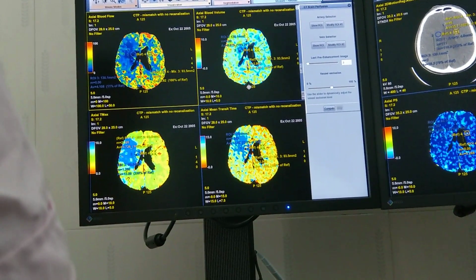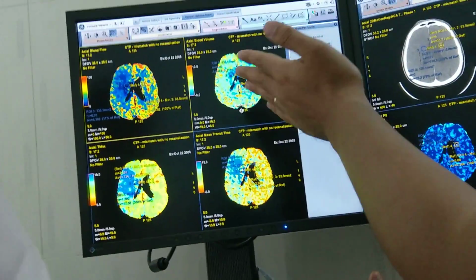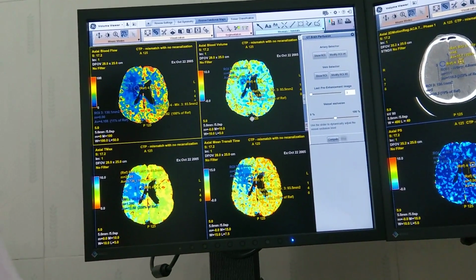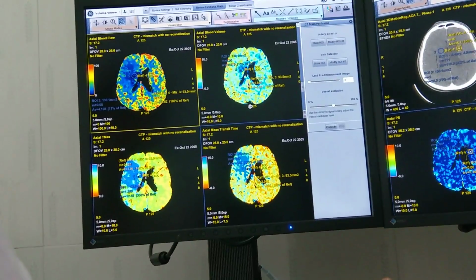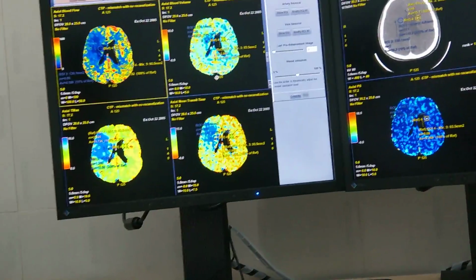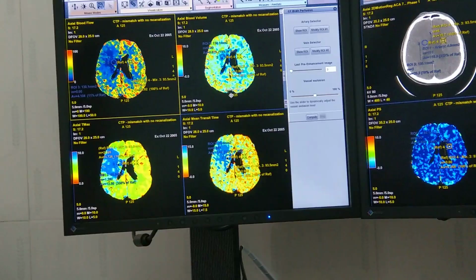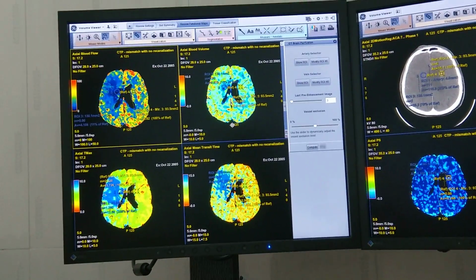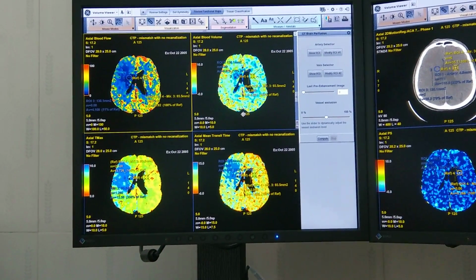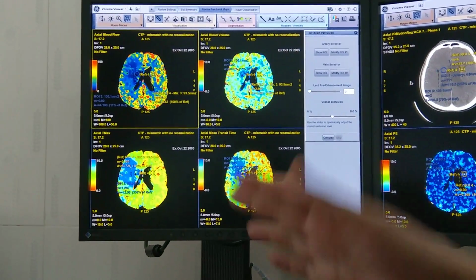What do we use for CBV or CBF? For CBV is the same. If CBV is for infarct, CBF is for tissue at risk, for penumbra. CBV for infarct, right? Yeah. CBF for penumbra. Penumbra and infarct. Thì thường mình sẽ so sánh thằng CBV, cái hình ảnh cũng thấy rất dễ phân biệt hơn, rất điển hình. Vậy là thường đánh giá về nhân của dòng máu mình sẽ đánh giá phần CBV, còn CBF mình sẽ đánh giá phần penumbra. It's the same. You can use CBF for stroke also. Nhưng mà khi anh đo về giá trị thì cả hai đều giảm. Okay. Sorry.